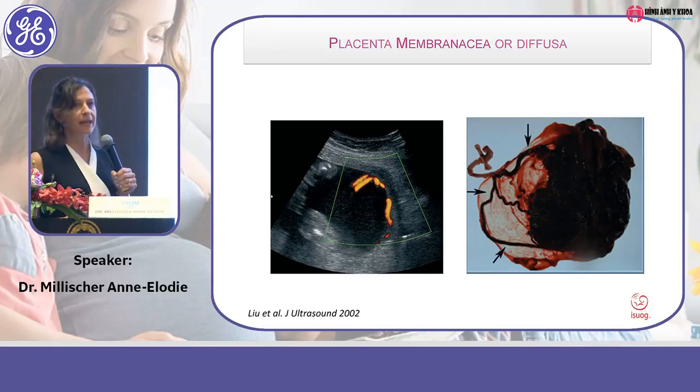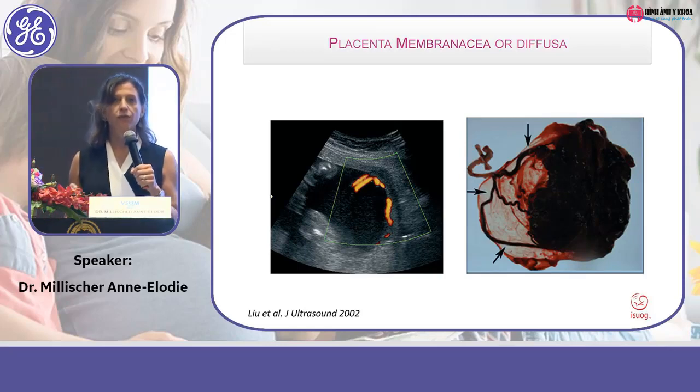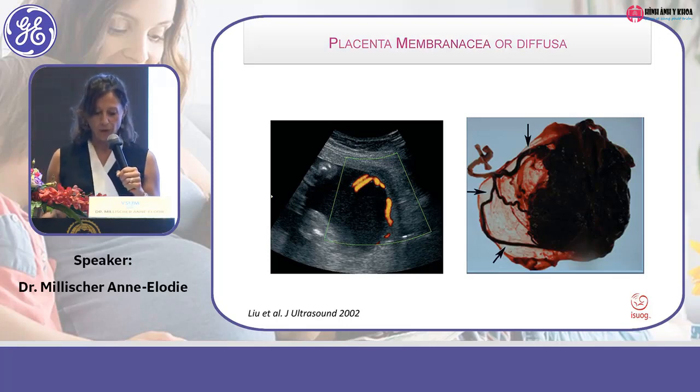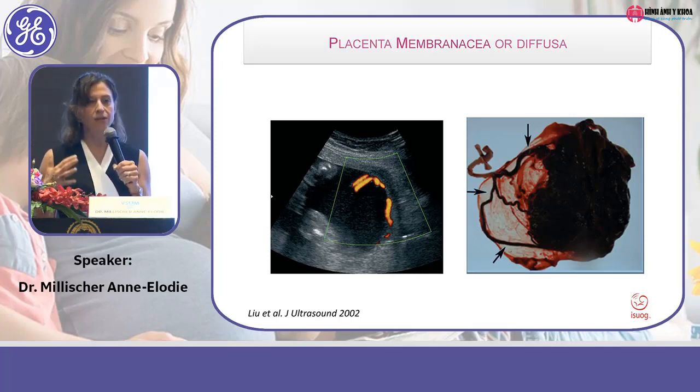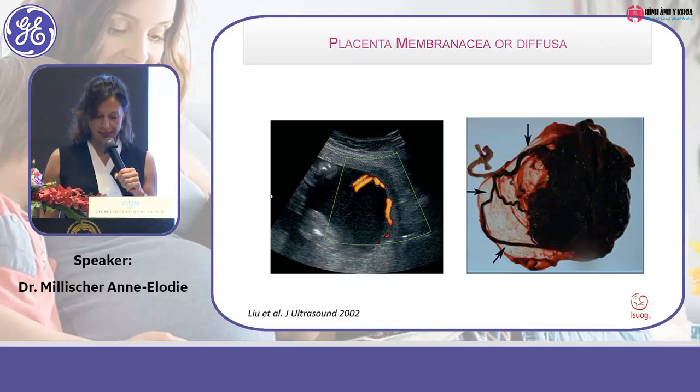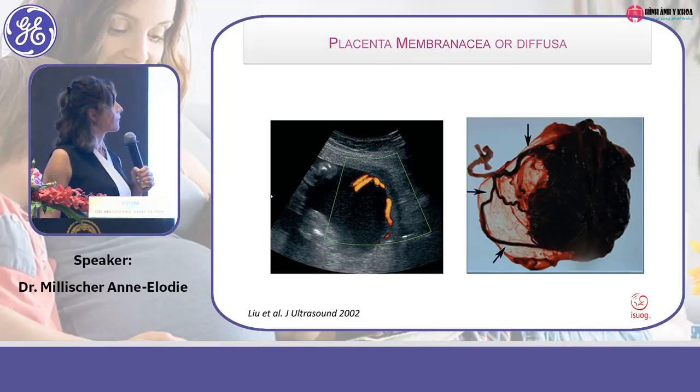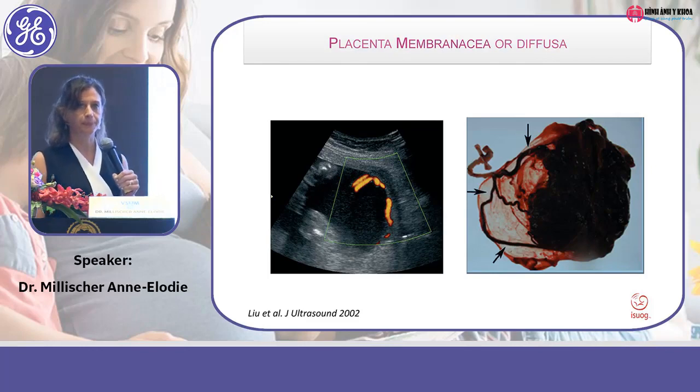So all these aspects are a variant of the normality, but we have to know this aspect to correctly describe and follow up thoroughly those pregnancies. Cho nên nãy giờ tôi đã nói là về các hình dạng của bánh nhau, các bạn nên nhận diện được nó để mình có một kế hoạch theo dõi trong thời kỳ thai nhé.